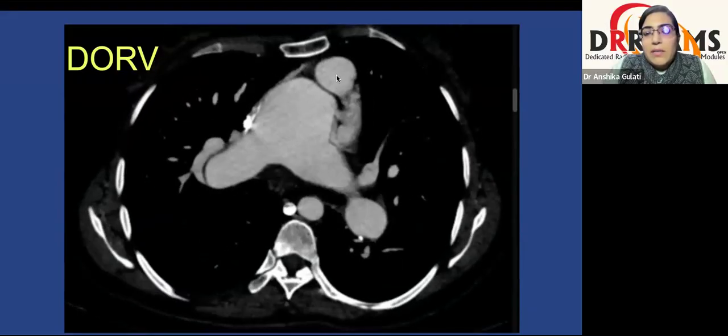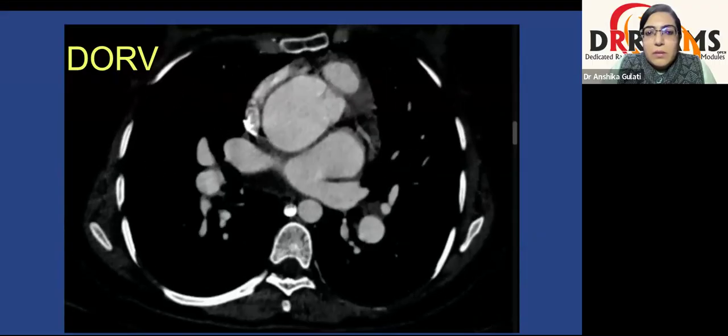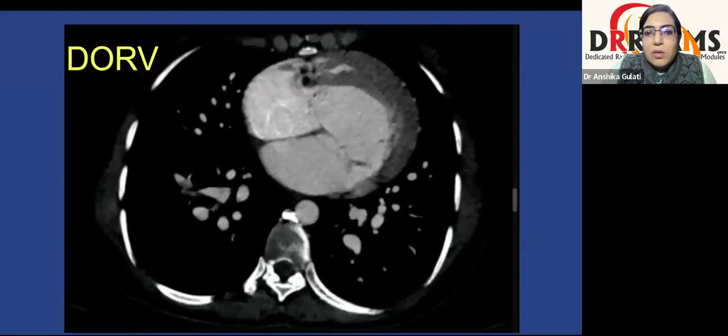This is pulmonary artery, this is aorta. So aorta is anterior and to the left of pulmonary artery, which means there is LTGA type of relationship of great arteries. Fourth step is AV relations, that is atrioventricular connections. Veno-atrial concordance has told us that this is RA, this is LA. Loop rule has told us that this is RV, this is LV. So RA to LV and LA to RV. So there is AV discordance.